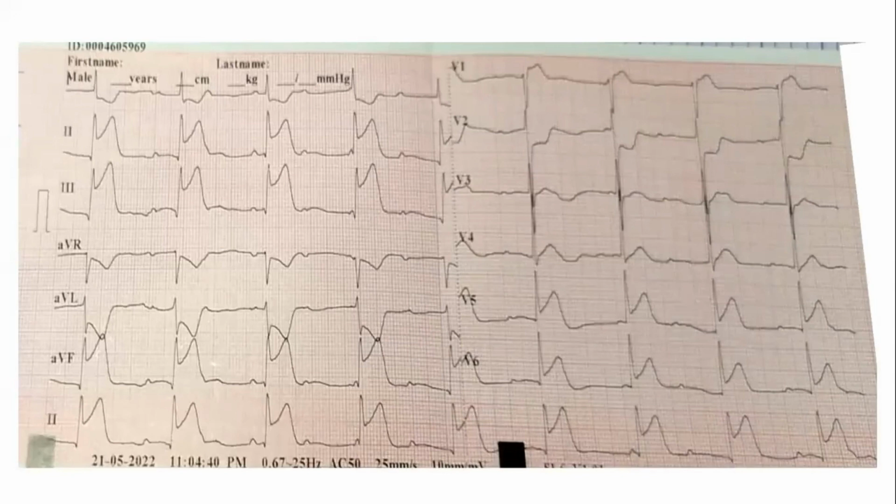This ECG requires a definite diagnosis. So when they give you an ECG with an easy diagnosis, they expect you to write all the associated findings or association with that pathology. So anybody who would like to comment on this ECG?